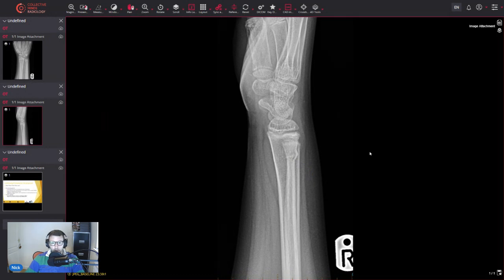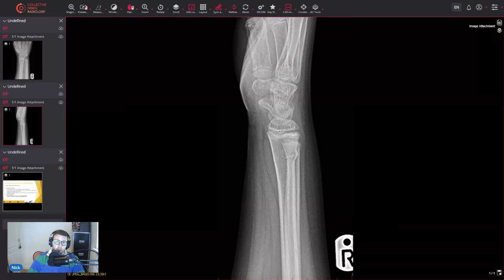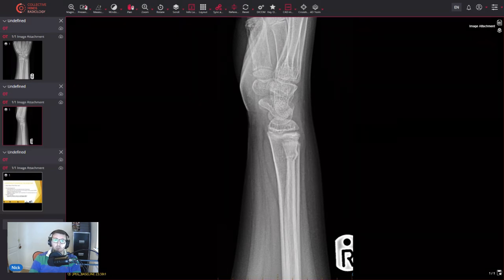These types of patients, a lot of the treatment is conservative. It may require some closed manipulation if they're quite severely displaced, with a cast applied for 6 weeks. Occasionally, if they're minimally displaced, a splint may be applied. This is often the case with the buckle fractures. So that's why it's important to distinguish between these two types of fractures, because it may alter the treatment. They may need some orthopaedic follow-up as well.